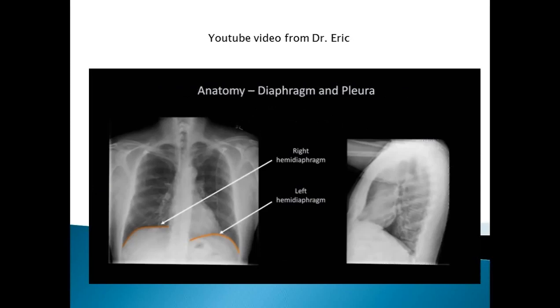The pleura, which is a double membrane that surrounds each lung, is outlined here, but is normally invisible due to its thinness. However, knowledge that the pleura is there is essential for diagnosing a pneumothorax, pleural plaques from asbestos exposure, and pleural thickening. In addition, there are spaces on either side where the diaphragm meets the thoracic wall. These two spaces, seen on the PA, are usually called the right and left costophrenic angles, though the term costophrenic sulci would probably be more semantically accurate in most circumstances.